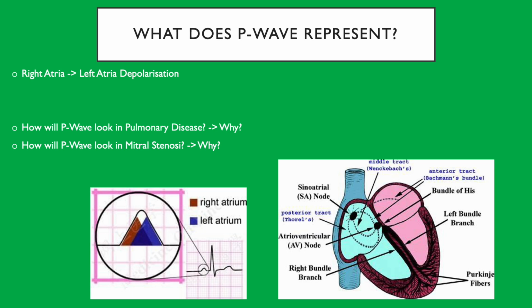Don't say right or left. It's both of them. The thing is that at some point they overlap. So this is a vector, right? It's electrical activity, and when they overlap, it's higher. So it doesn't follow exactly the wave. Here they overlap, so it's summation. So it makes a P wave. First is the right atrium, then the left atrium. Then you get your P wave.